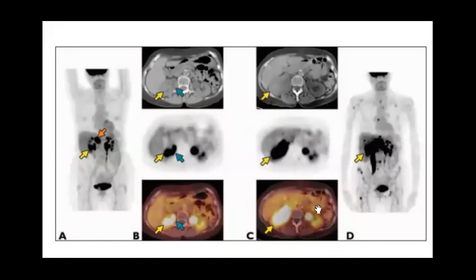it is involving almost the whole right kidney, and it shows progression as you see here. It starts like this, and after maybe a while, I don't know how many months he has, but this was baseline, and this is the follow-up of this patient. So you can see clearly that this patient, what happened here, regression or progression? Yes, after 1 month, it has progressed. Yeah, and you can see, yes, perfect.